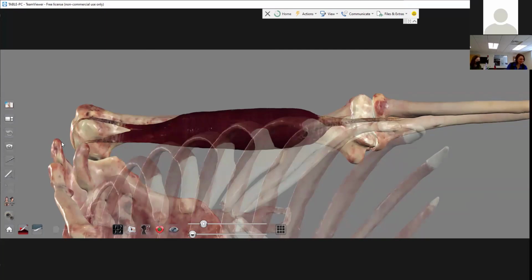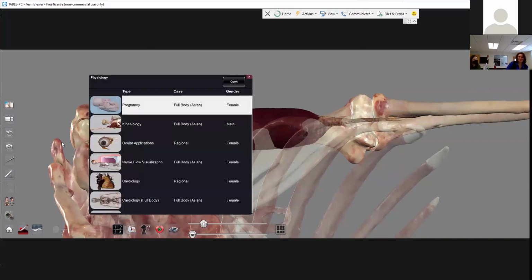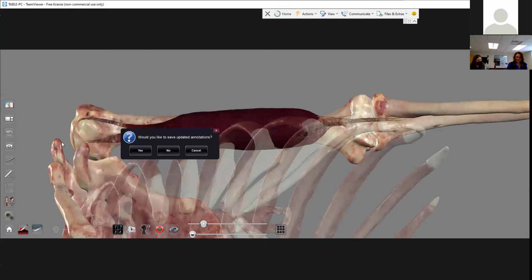Yeah, I guess, I don't know if we want to see physiology. So we just exit application or no? You can just hit physiology. Oh, just straight from here. What do you want to say? Pregnancy? Let's do kinesiology. You can hit no on that.